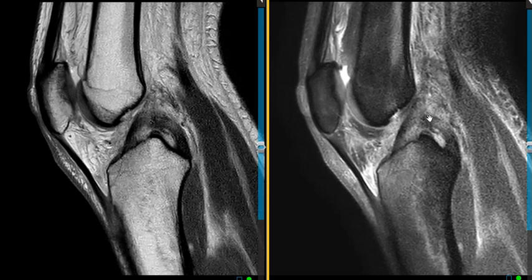So this happens when people tear their PCL. They also get to tear the posterior joint capsule very commonly. And these two things together, the bone bruise in front and the edema here in front, means this is impacted somewhere up here in front, usually the femur, and then it's stretched back here.